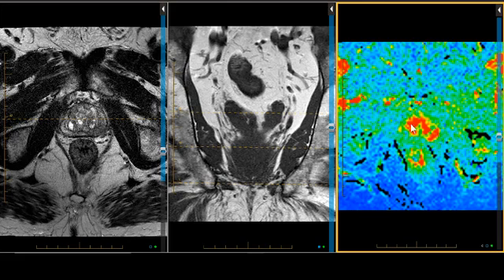It also picked up these innumerable TZ central region of the gland, areas of hypervascularity, which are extremely common. So our DCE MRI said that the lesion was hypervascular, fire engine red, and that it had a pretty decent washout, because the hue determines the washout. So I don't rely on the hue very much in CAD for the prostate.